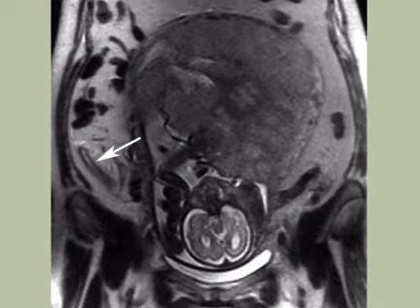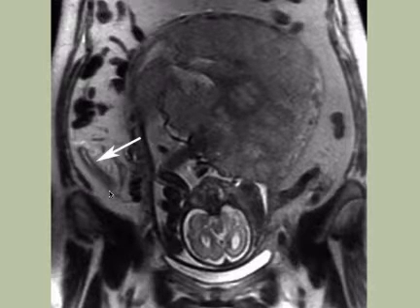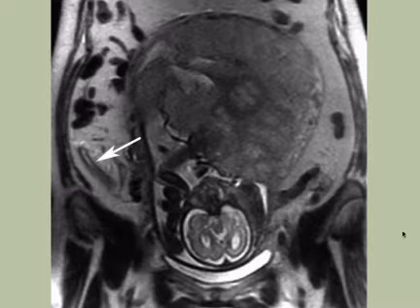Here we have an MR scan. These are T2-weighted sequences. They're very rapid and they do not require contrast. You'll also notice that this is a pregnant lady, so it is particularly appropriate in her case to avoid CT. The appendix shows mild wall thickening, some luminal fluid, and some mild inflammation around the appendix. Again, undoubtedly early acute appendicitis.